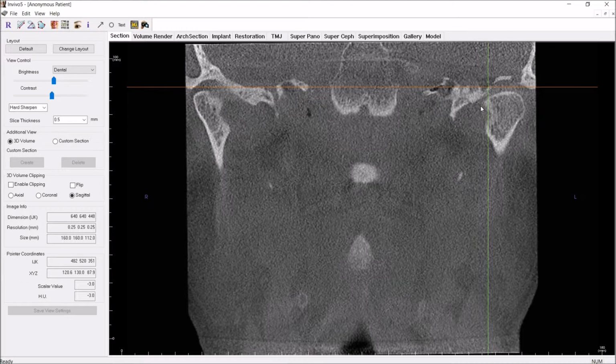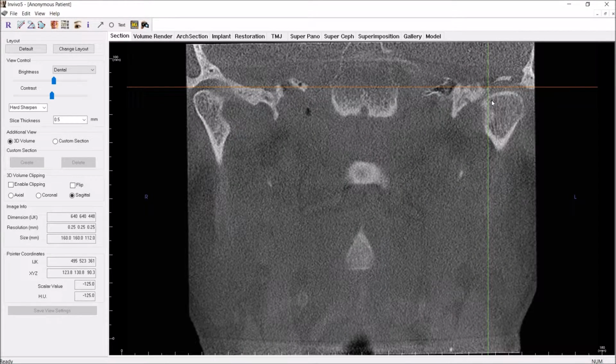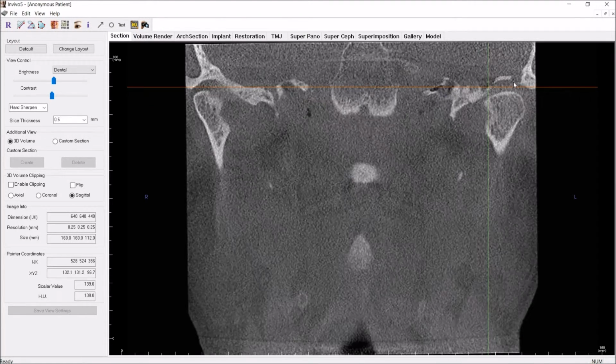And this, because it's coming from the intracranial, and because of the way it looks, kind of undulating borders, but they're well defined, they're corticated, these are completely consistent with an anatomical variation known as arachnoid granulations. So the arachnoid is part of the meninges that cover the brain. You have the pia mater, the arachnoid mater, and the dura mater. And this is just a herniation of arachnoid through the dura mater, and it tends to resorb a little bit of the inside of the cranium and the inside of the skull.